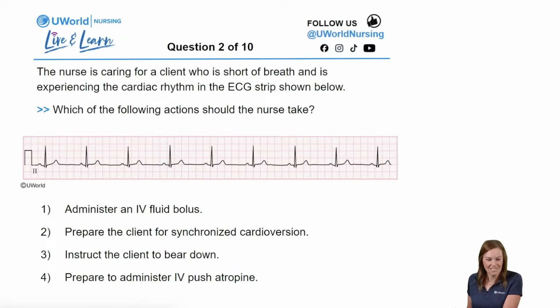All right, let us know what you think. 30 seconds on the clock. What are you guys seeing? Bonus points if you can tell us not only the answer, but what you are seeing in the strip. So let us know. All right, good answers, you guys. Good job. Let's see what you guys think.